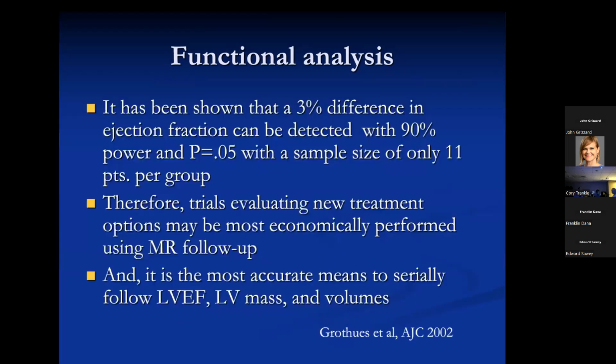The ejection fraction. The important thing to know about MRI as opposed to echocardiography is that you can find very small differences because it's very reproducible. That is, if I do a series of tracings of circles like that, and then Corey Trankel does it later, and if we differ, then we'll know that Corey is wrong. But leaving that aside, and seriously, you'll only have at most 2 or 3% difference between different observers. I think the average in studies has been about 4%.